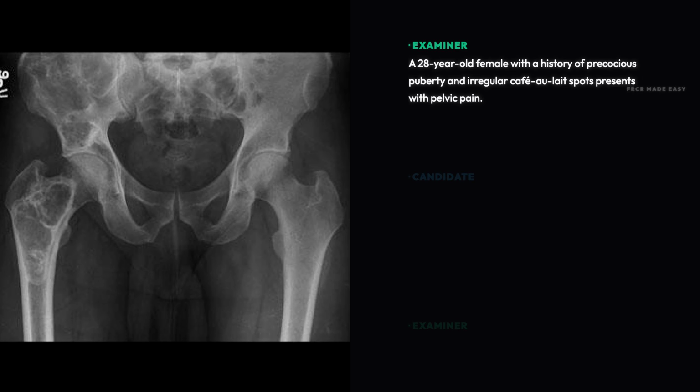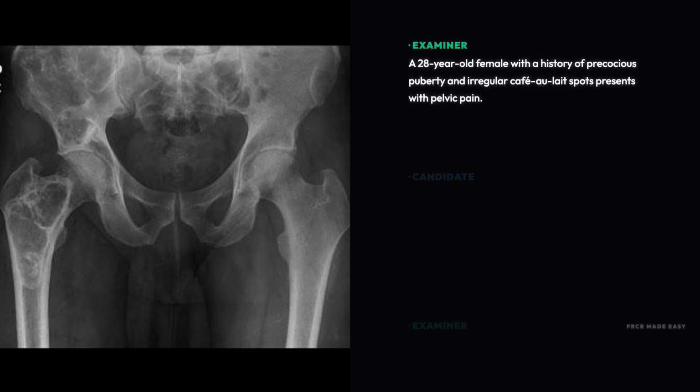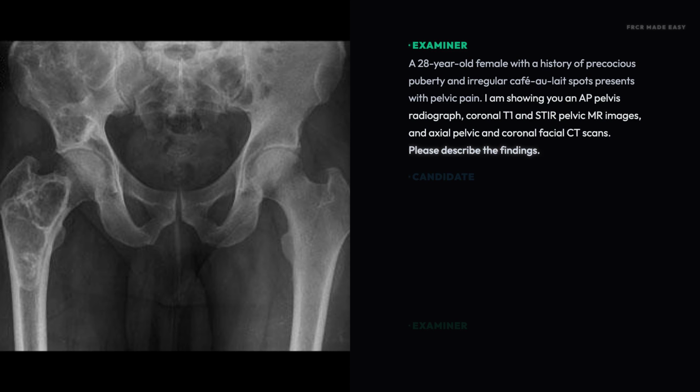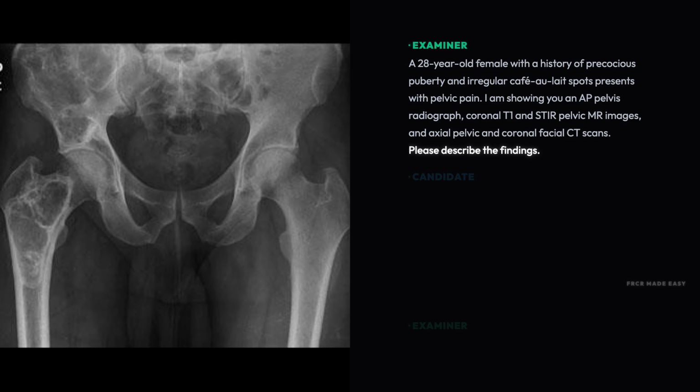A 28-year-old female with a history of precocious puberty and irregular café-au-lait spots presents with pelvic pain. I am showing you an AP pelvis radiograph, coronal T1 and STIR pelvic magnetic resonance images, and axial pelvic and coronal facial computed tomography scans.